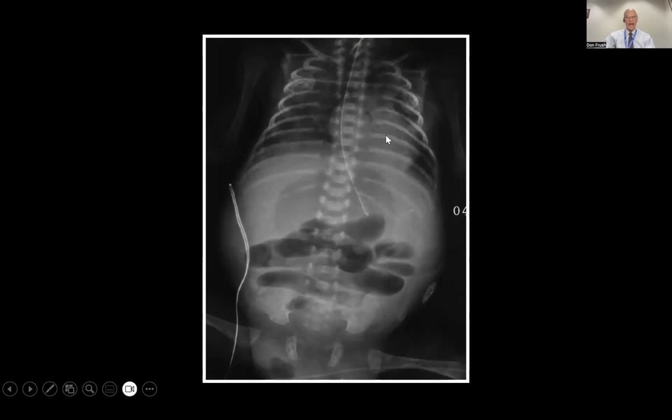Now we'll move down to the abdomen and talk about abnormal air collections. I already talked a little bit about, when we look at those various features of the bowel, air in the wall, which is pneumatosis, and air in the portal venous system, because the air in the bowel wall drains up through the mesenteric veins and forms the portal vein. That's why air in the bowel wall can get up to the liver.